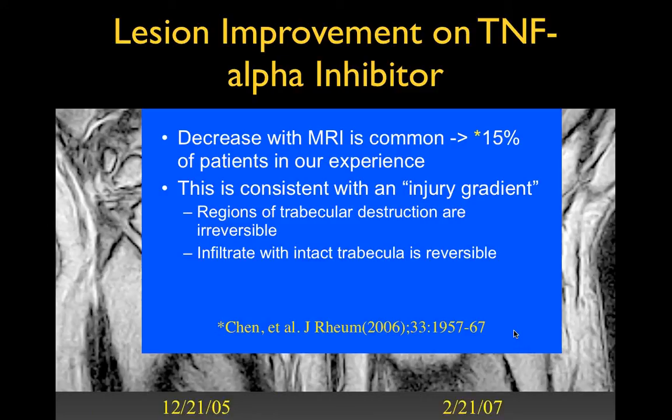So you don't actually see that. Yeah, you don't have joint fluid going into these. These are not filled with joint fluid. Yeah, they don't communicate. Most of these don't communicate with the joint space.